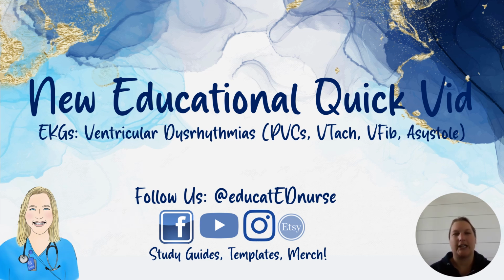I'm Erin from Educated Nurse, and today we're going to talk about ventricular dysrhythmias. So PVCs, premature ventricular contractions, Vtach, ventricular tachycardia, ventricular fibrillation, or Vfib, and asystole.